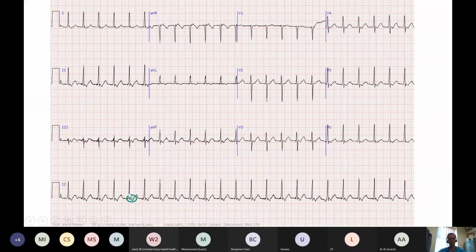Every QRS is followed by a little downwards deflection before the T wave. So what's going on there? Is that a very strange biphasic T wave, which can be seen everywhere? Is that a part of the QRS? But it's a lovely narrow QRS. This is a very slow deflection occurring significantly after the QRS seems to have completed. So what do you think that little deflection is there?